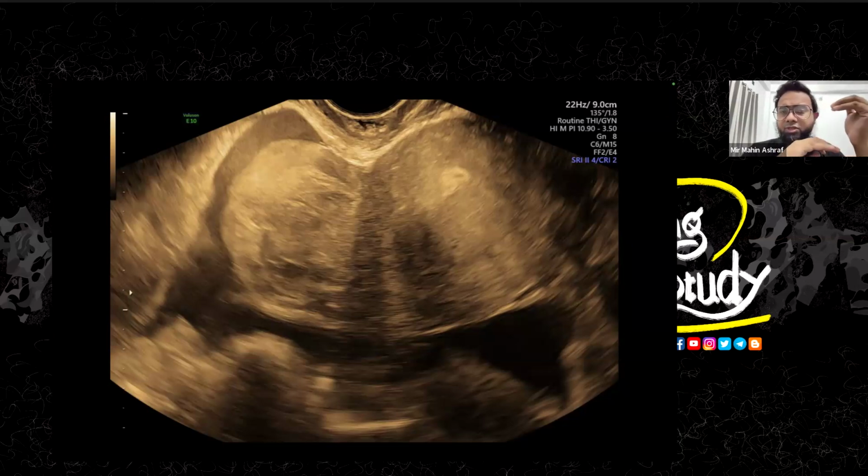In case of color Doppler, if you see the perisac vascularity resistive index less than 0.5, it goes in favor of ectopic, but it is not very specific. If it goes less than 0.4, then you should be very careful, because this is an ectopic. So intact ectopic pregnancy usually has a perigestational sac vascularity of less than 0.4. But if it gets ruptured, then the resistance gets higher, because there is no more need of a good amount of flow inside. So at that time, we get confused.